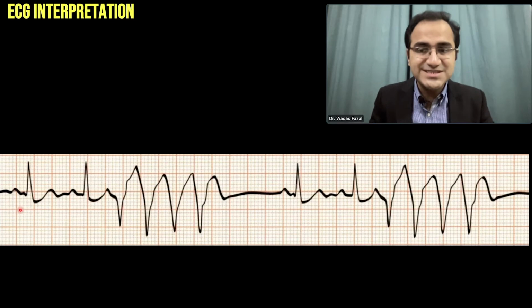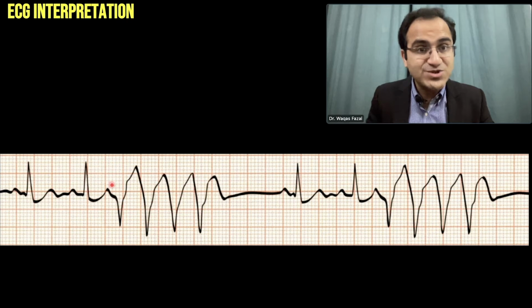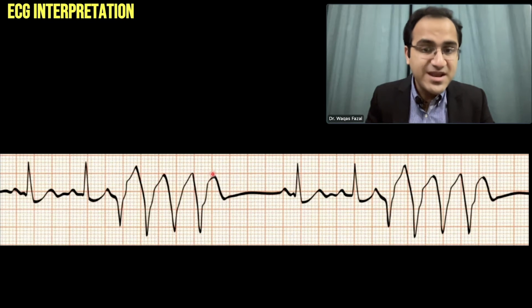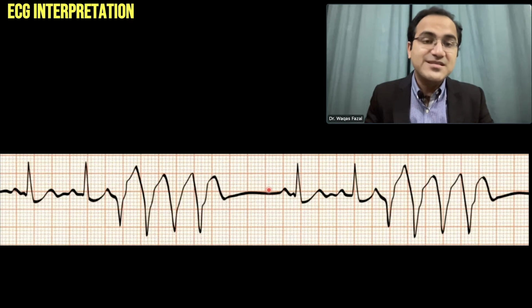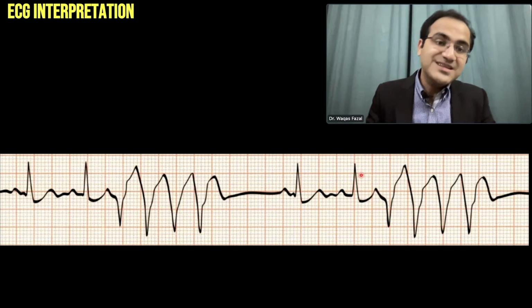Now in this ECG, if you can see, this is a PQRS T wave, a normal sinus beat, another normal sinus beat, and now the premature ventricular contractions start to appear. Another premature ventricular contraction, another PVC, another PVC. But then this sequence of PVC ends over here, and then sinus beats start to appear, another sinus beat appears, and after that there is again a PVC, another PVC.